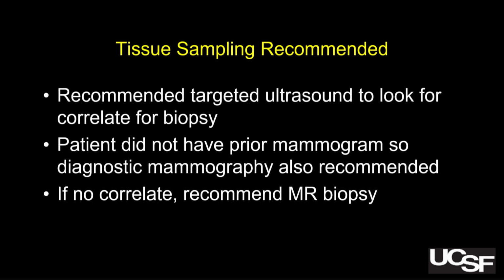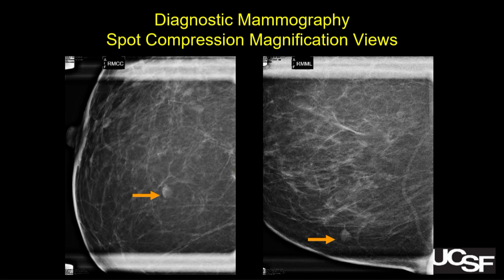Patient did not have a mammogram, started with the MR. So, okay, fine, that's good. I mean, if I had to start with something, my preference in a high-risk patient would be the MRI. But a mammography is still helpful. In this case, we did the diagnostic mammogram with the diagnostic ultrasound, hoping to see a correlate. And she was reasonably fatty, so we thought, high chance we'll find it. And there it is, we think.